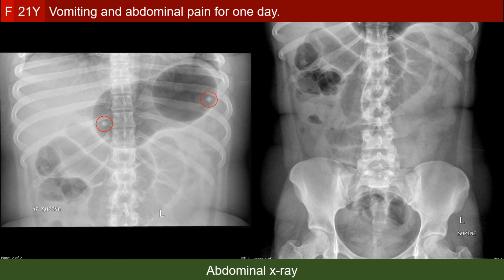In this clinical scenario of intestinal obstruction in a patient with gastric balloon insertion, the possibility of gastric balloon migration is an important consideration. To explore this possibility, we need to do 2 things. We need to search the X-ray for the metallic part of the balloon. And here we have a perfect example of this metallic part in the 2 intragastric balloons. We need also to ask the patient how many balloons have been inserted.